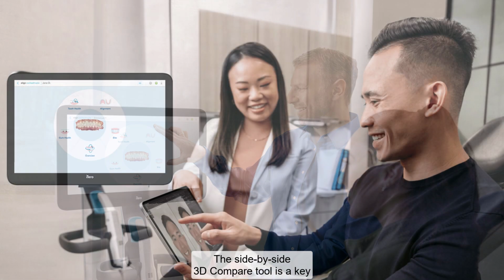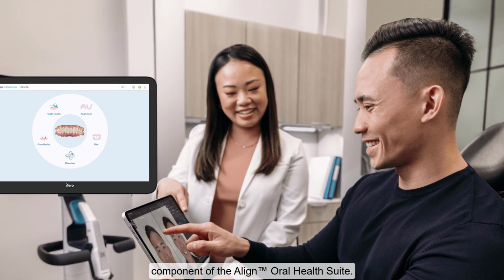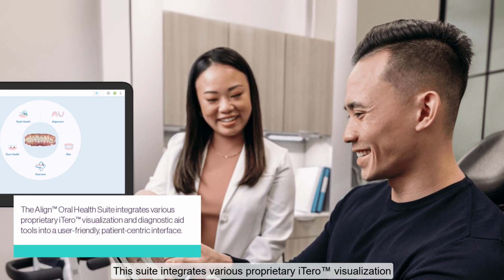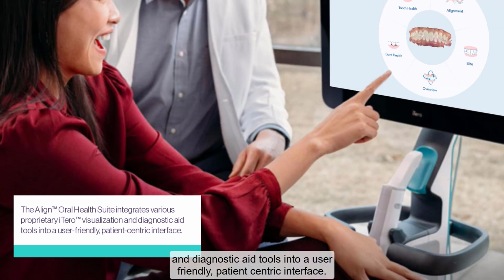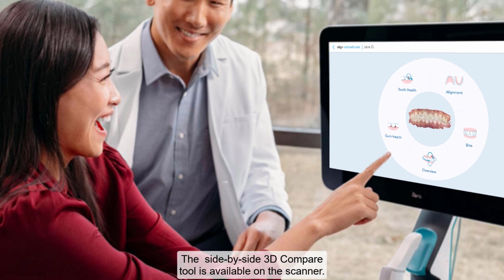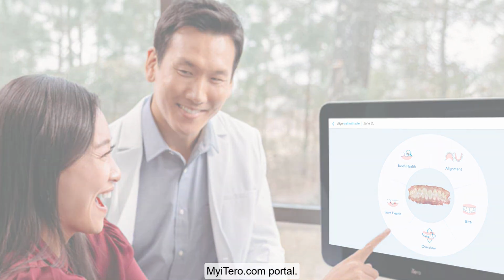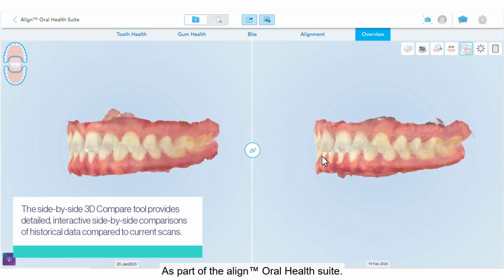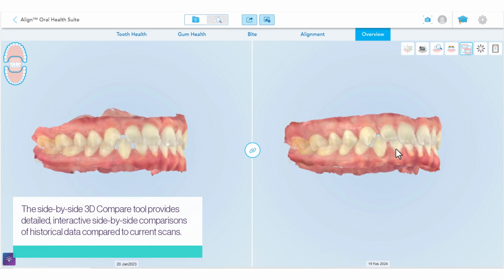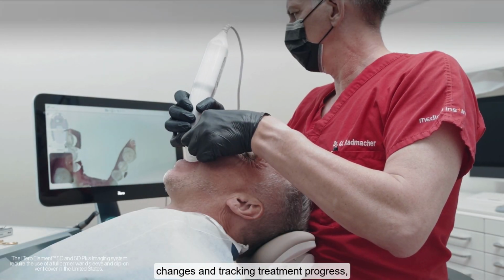The iTero Side-by-Side 3D Compare Tool is a key component of the Align Oral Health Suite. This suite integrates various proprietary iTero visualization and diagnostic aid tools into a user-friendly, patient-centric interface. The iTero Side-by-Side 3D Compare Tool is available on the scanner and the MyiTero.com portal as part of the Align Oral Health Suite. It provides detailed, interactive side-by-side comparisons of historical data compared to current scans and can be used for assessing oral health changes and tracking treatment progress.